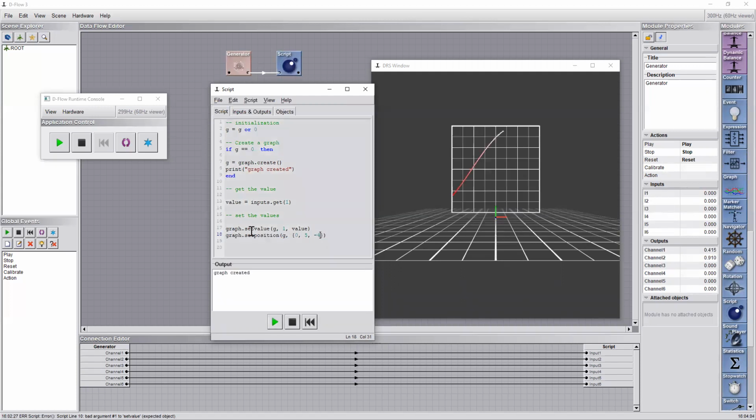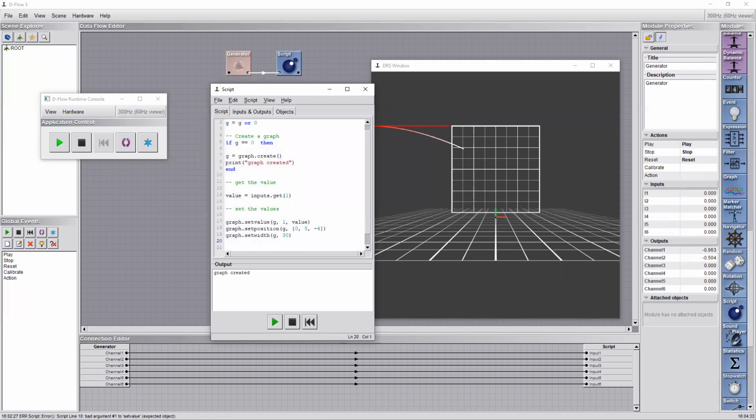So you see just moving there, and you can actually change it as you go, just on the spot. Isn't it cool? Okay. And then you can change other things, like let's say set the width, right? The same thing, graph, and then the width can be like 10, can be 20, can be like 30, something happens, but something doesn't work. So when you make changes like that, you need to do something to basically redraw things, all right?